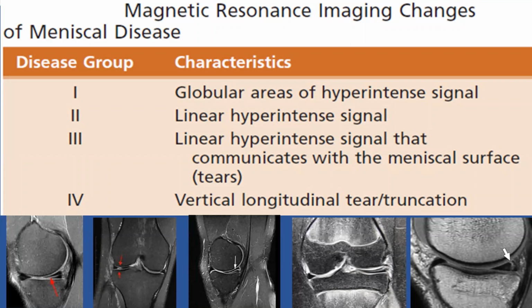We know that on removing the meniscus, we do harm at times, especially in women, where they end up having osteonecrosis of the medial femoral condyle because they have no longer any protection. So you have to know which meniscus is torn, which is not. If you look at the slide below, on the left-hand side, you have a horizontal tear, and it is communicating with the articulation. This is a torn meniscus.